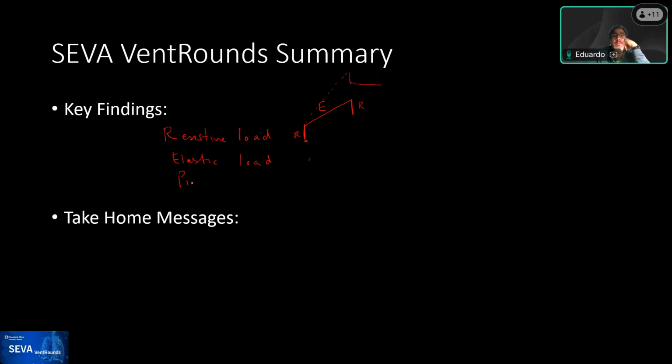And then we saw the PMUS and how the PMUS actually deforms your waveform down when there's presence of PMUS in the waveform. And when that's present, you cannot really see the elastic or resistive load. It models it and it makes it disappear. Sometimes you can see through if it's a short effort, but when it's present, it's hard for you to see. And sometimes the only way to see it is to see elsewhere or wait until a passive breath occurs.